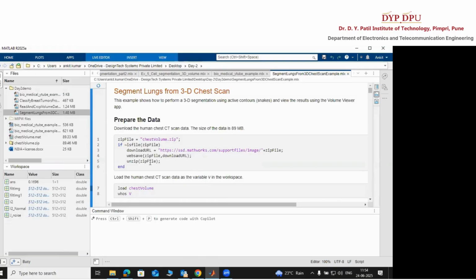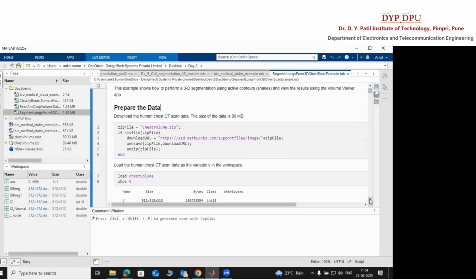Yeah. So here you may find one folder with the zip file. If you extract it outside of the volume, you can do that. Okay. So if you want to check, then you can extract outside of MATLAB and then pass a command.